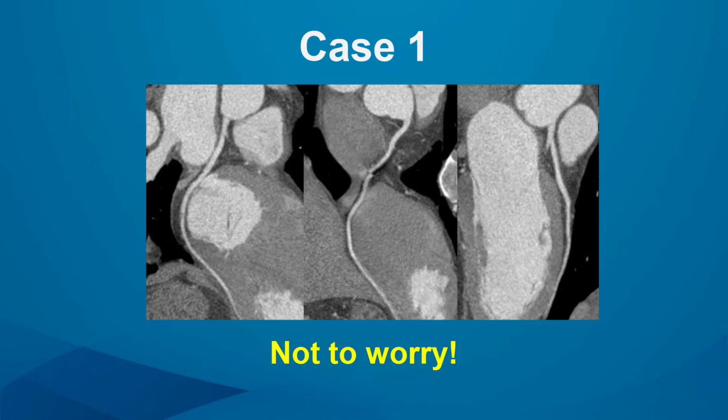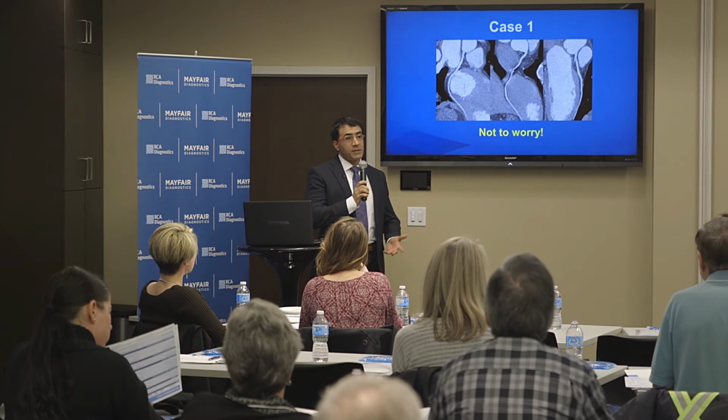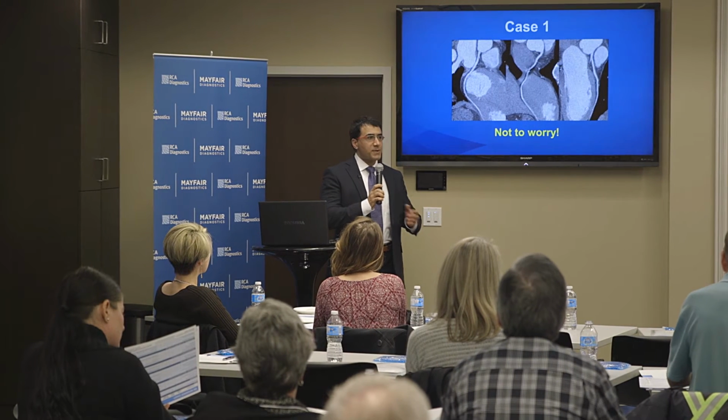So he comes in for a coronary CT, and these are his images. As you can see, all the coronary arteries are normal, and this patient can stop worrying. The physician can stop worrying, can send the patient home, we can give reassurance, and there is no coronary artery disease. I don't think there is any treatment except for lifestyle management and all that.